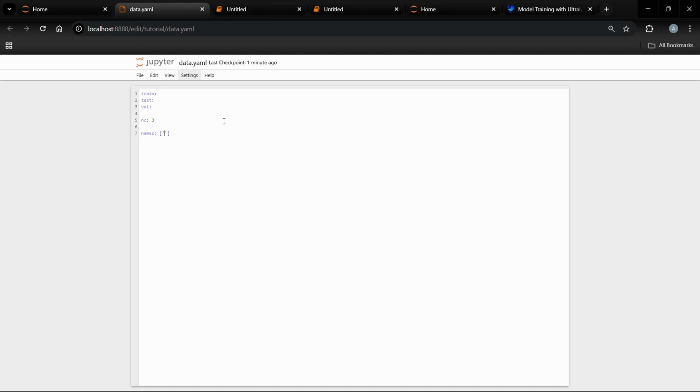Let's suppose I'm specifying low, medium and severe. So this will be your class 0, this will be your class 1, this will be your class 2.